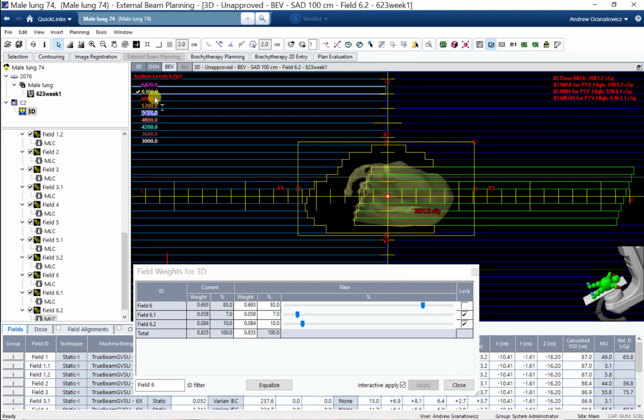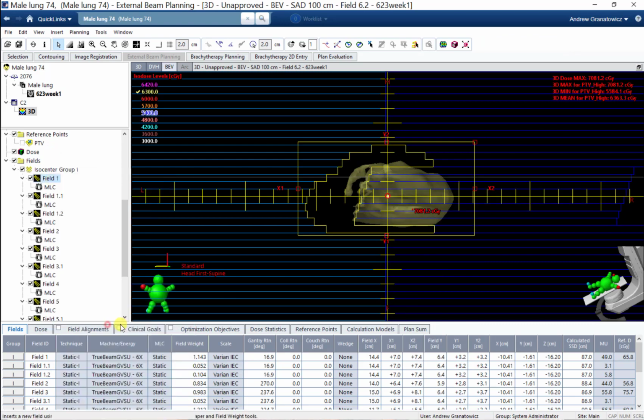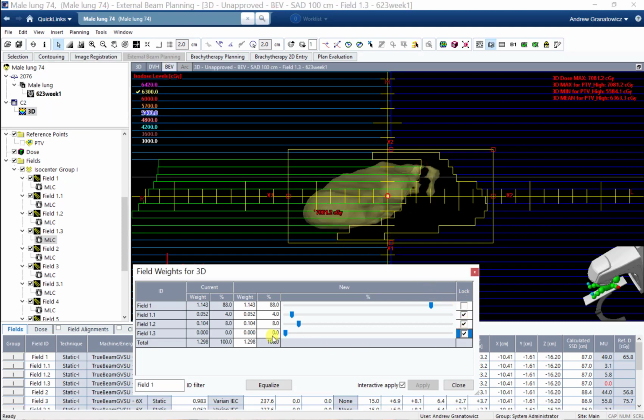So this is only 105, right? So I'm not terribly worried if I get rid of all that 105. It's going to start spilling out on me probably a little bit like this. As long as I see this max dose number coming down, though, I'm going to be happy. I'm just going to keep going in circles. If this 105 starts to spill out on me too much, I will probably turn on the 107 line. Start to worry more about that.